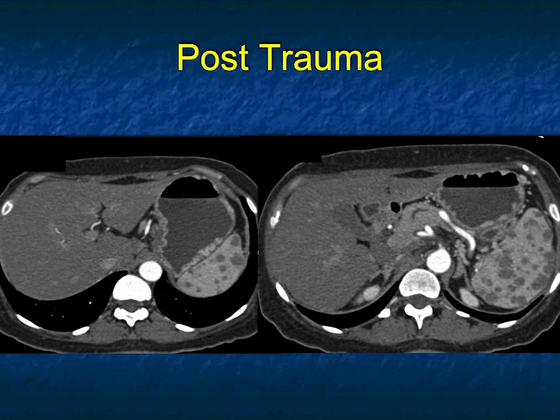This patient's post-trauma, and you see multiple lesions in the spleen, and that's not the appearance of splenic trauma. I don't see liver. I don't see any other organ injury. Now, if I told you the patient had multiple cysts in the spleen, you could think about that, but they don't look very cystic per se. If I told you the patient was febrile, you could think about abscesses. There are a number of things, hemangiomas, but they're usually, at least in part, vascular.